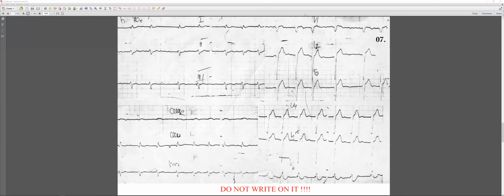And your ECG is ready. And the cursor. Okay, okay. Wait a minute, I have to find you. Sumir, yes, I found you. Now, left click and after you can use the cursor. Okay.